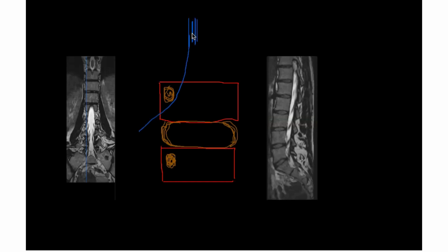The other root is here, and we start approaching. Now let's say this is your L3, this is your L4. So which root is this? L3. And this is your L4. This is 4, this is 3, right?